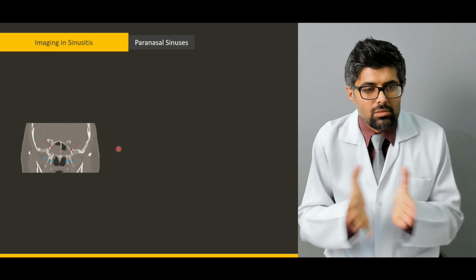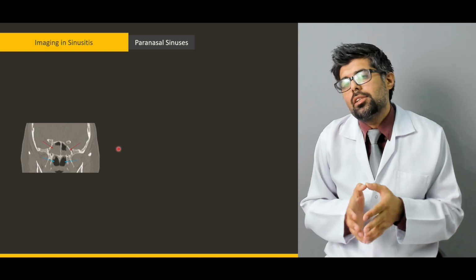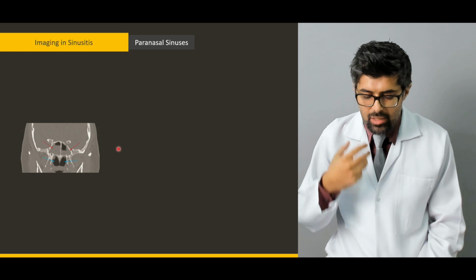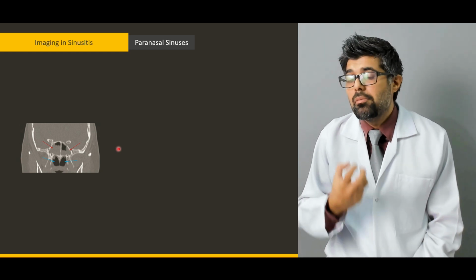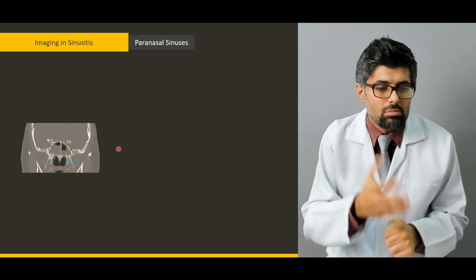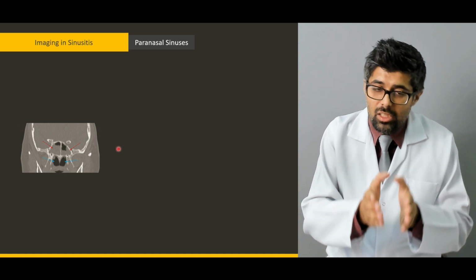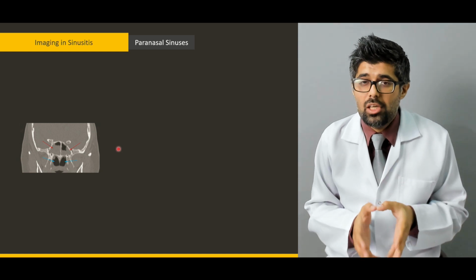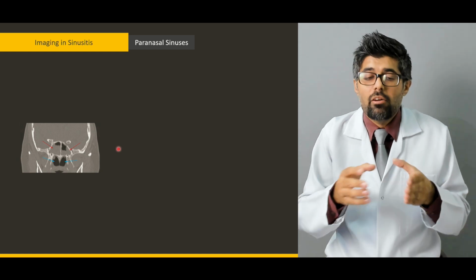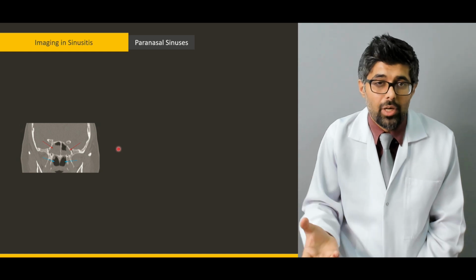Okay. As I earlier said, imaging in sinusitis only happens when there are certain complications, and paranasal sinus inflammatory disease is one of them. Here you can see a CT scan of the sphenoid sinus. Now the sphenoid sinus is not clear. It is opacified. Both sides are filled with hyperplastic mucoid membrane.